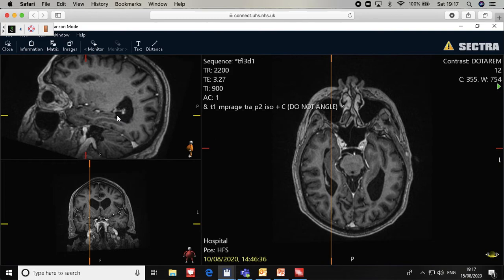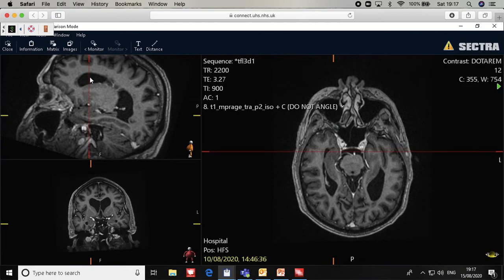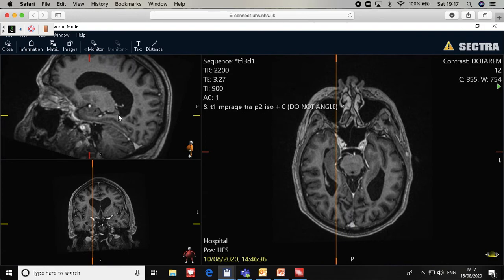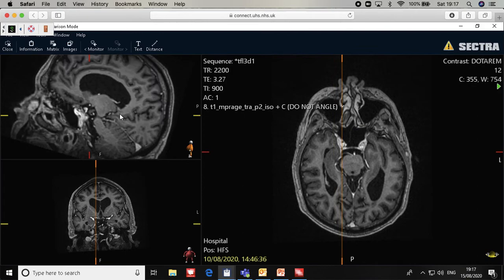If we find gray matter beyond that, this will be the amygdala, and we don't have to take it into consideration. So be careful with the amygdala, don't include it. Just stick to the hippocampus in the floor. This is the head, this is the tail, and stick to the hippocampus in the floor of the lateral horn of the temporal lobe.